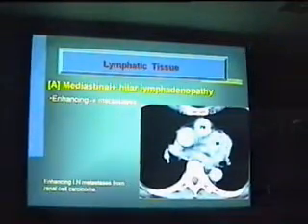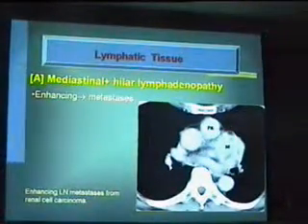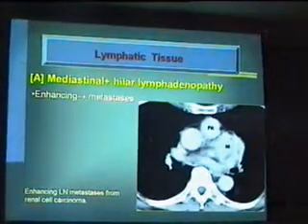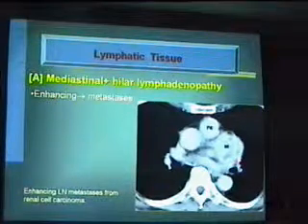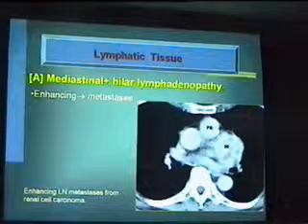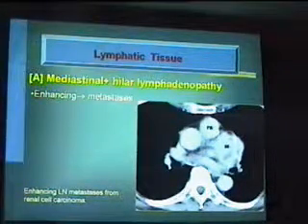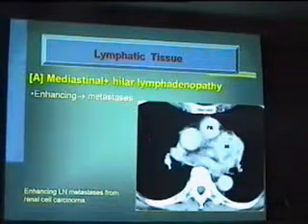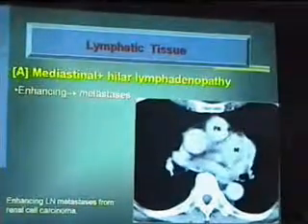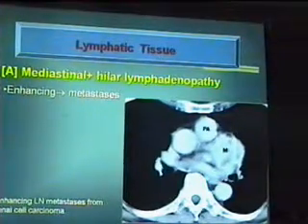الباترن اوف انهانسمنت قلنا they do enhance مش كده؟ وعندي هنا اهو البالمونري ارتري والاسندنج والديسندنج اورتا، شايفين it has more or less a marginal enhancement وهي نفسها برضه شوية enhancing، لكن look at the attenuation value, there is a difference، ما هياش to the standard of the enhancement of the vessels. اوكي؟ والحالة دي كانت جاية ميتاستاتيك من renal cell carcinoma.